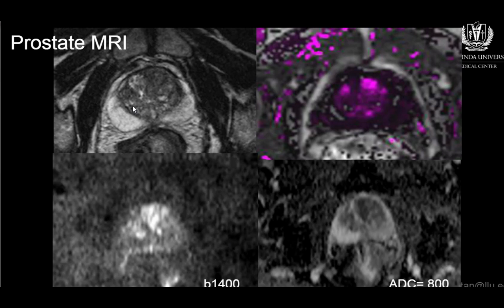This is an example of another type of MRI. It's called prostate MRI. The American Urological Association and the American College of Radiology now recommend MRI before any biopsy, before prostate biopsy. And so we can do this by looking at both anatomic and functional imaging. So this is a T2. This is the rectum back here. This is the pubic rami, and then you have the prostate. This is the T2 images. And then we can get what we call DCE, which is with arterial enhancement. We give contrast. And then we can get diffusion weighted imaging, these dark images down here.